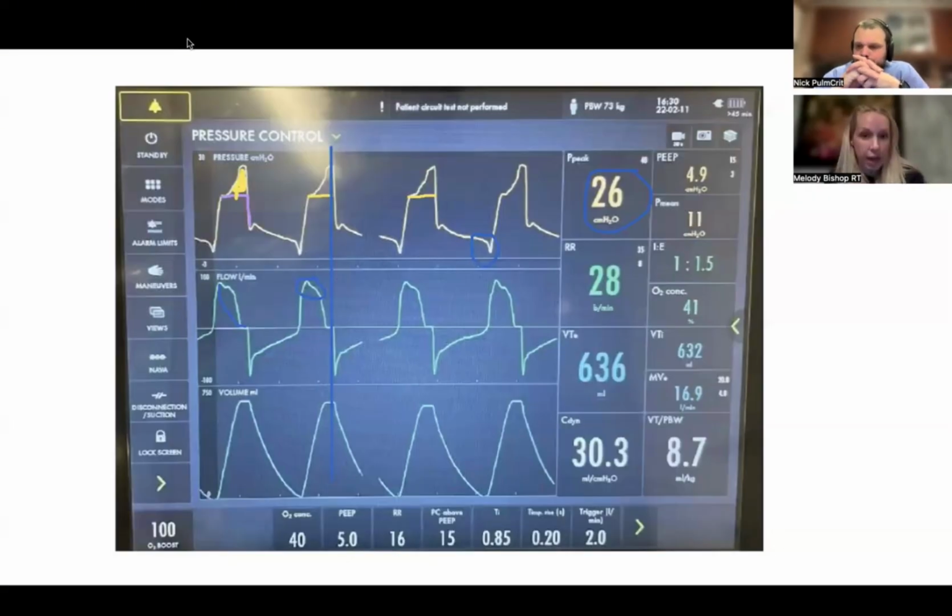I think pressure support is a great option. I think it solves a lot of problems. And when you are in the weeds with a bad waveform that you don't know how to navigate, one of the best things you can do is eliminate variables by seeing what your patient's doing as best you can. Put them on pressure support, on higher pressure support than you might think. When I say that, I'm not saying 22, but I'm saying give them a pressure support that's supporting their work of breathing, like 12 to 15, somewhere in that range. See what they are doing, and then you can work backwards. When you're lost, that's a good place to start.